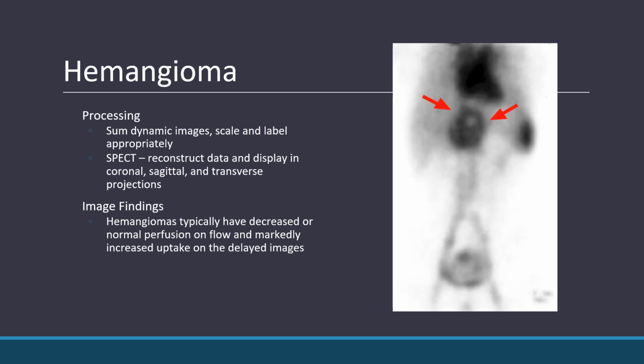And this image here on the right is a hemangioma. You'll see the outline very faintly of the spleen of the liver. You'll see the spleen here with a little bit increased uptake in parts of the spleen. You'll see the vascularities down the abdomen that bifurcate to go to each leg. You'll see activity in the bladder. You see the heart. And then where the arrow is pointing to, that is the actual hemangioma. And this one looks like a cavernous one because you see some areas of decreased uptake in the center, but really a SPECT study is going to be best to illustrate that.